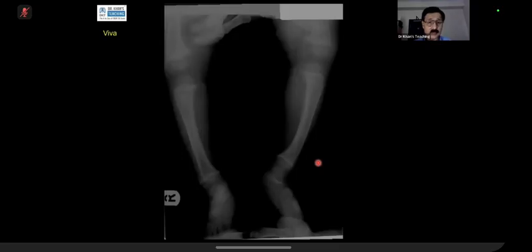Yes, please. I am presenting with the, look at the tibia. Yes, there's a lucency of the left tibia. I think of both tibia, more on the left side.